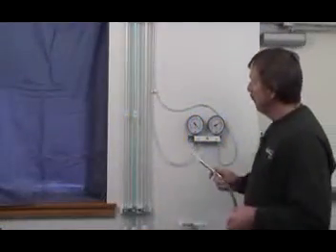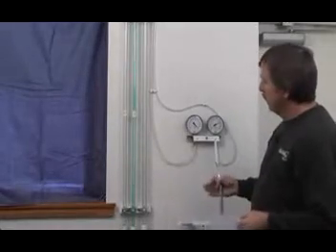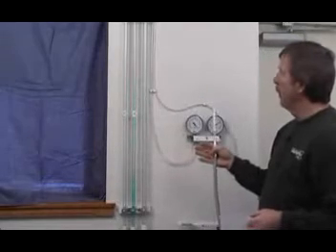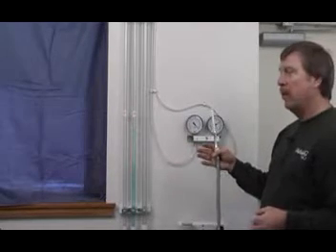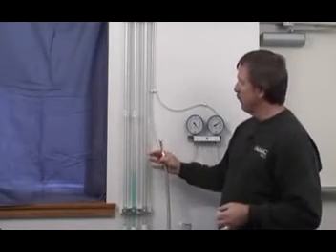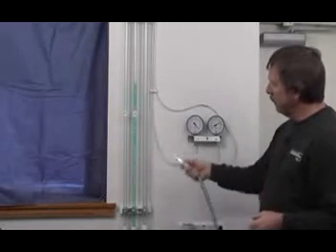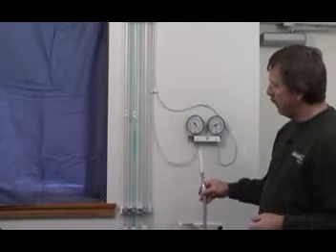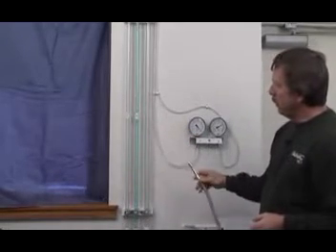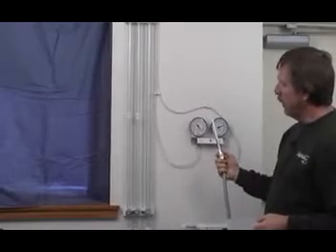A very important item in overhead piping is the diameter or size of the riser pipe. This is very critical because a dental operatory is a pretty quiet environment, with not much going on. If you get too big a piping going up the wall, you can get a lot of noise from this. In a half-inch riser, as you can see, the liquid will hold in there. You have a little bit of air leakage that lets it go by, but you don't see a lot of tumbling. And when you open up the suction device for several seconds, it will clear that line.